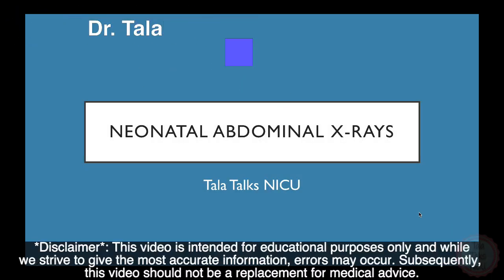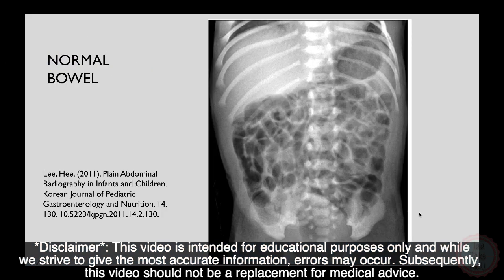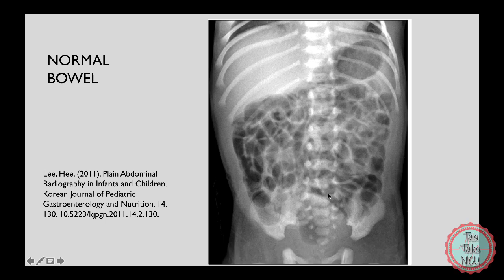I'm Dr. Tala, and let's go straight into reading neonatal abdominal X-rays. So let's start with a normal neonatal X-ray. So here you can see a normal bowel gas pattern.